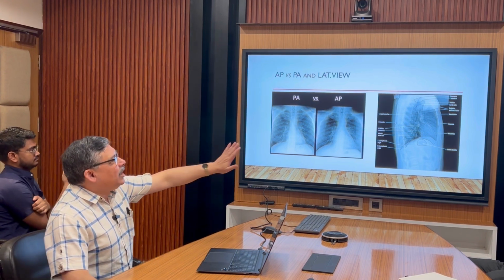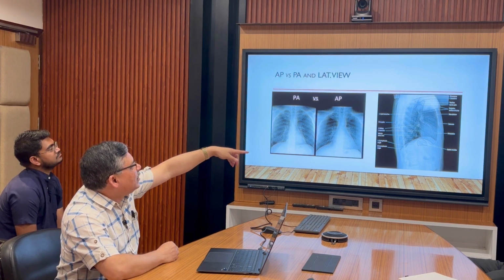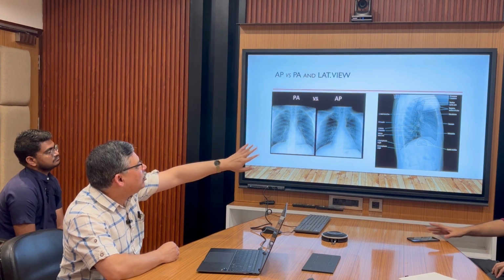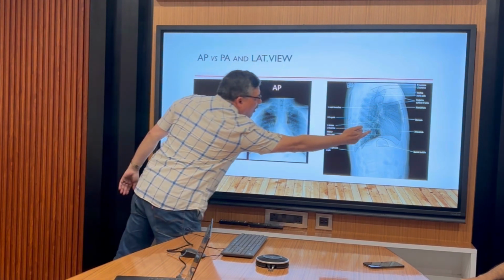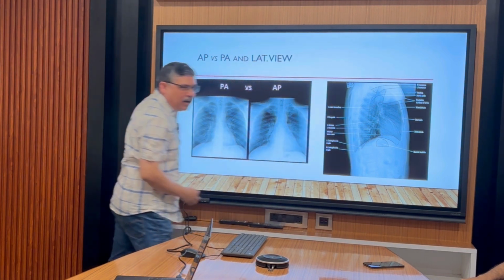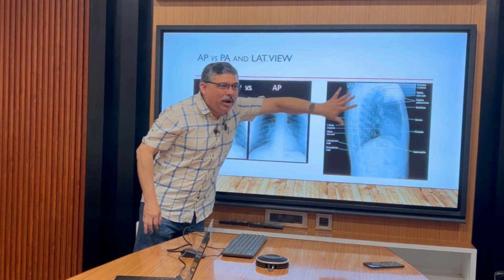This is a lateral view of the X-ray. It is very interesting. You see so many things. You see the humerus, the trachea, and the aortic arch. I will show you; there are beautiful X-rays. You can make out the heart. See the retrocardiac space now, so you can see it very well behind the heart. These are the two lung bases. You can also see the hila end on. The hila will be end on.